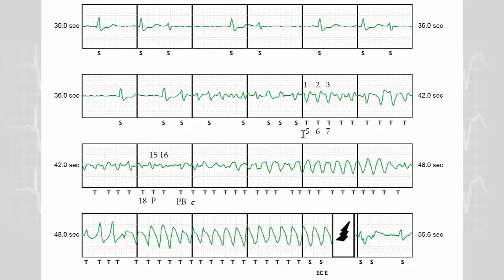So you can see this 18 of 24: 5, 6, 7, 8, 9, 10, 11, 12, 13, 14, 15, 16, 17, 18. So here you have 18 cycles of 24 that are considered as fast. Then there is a criterion of persistence, and we will see how it works exactly in the next tracings.